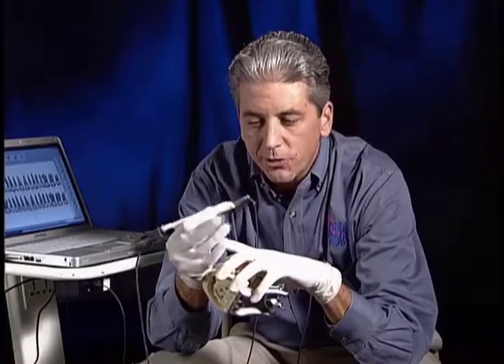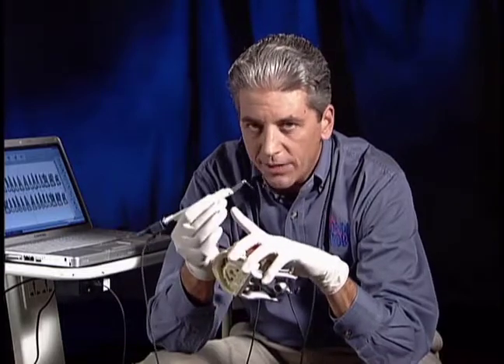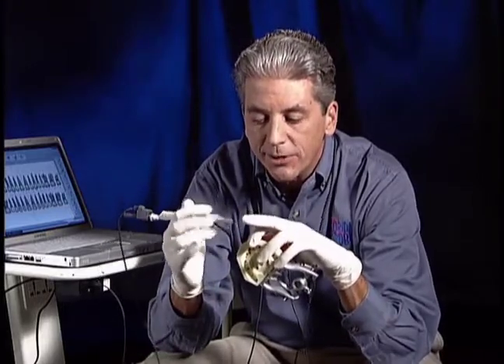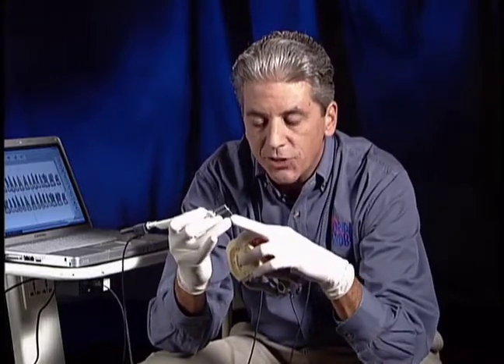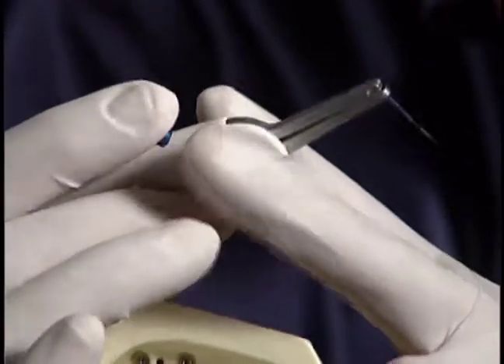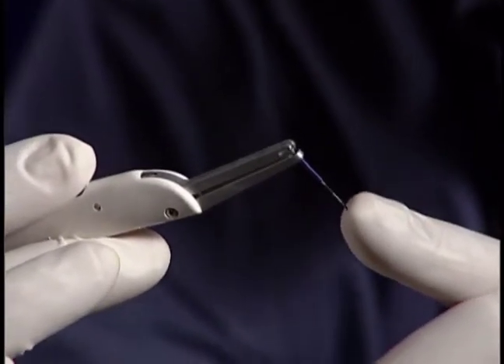The second issue is finger placement on the handpiece. Holding this handpiece is different than your traditional probe. I know that you hold and fulcrum in various different manners, but it's more critical with this in that the tip needs to be free floating. First and foremost, this little blue button serves a purpose. It's a frictional override of the 15 grams of constant force pressure.